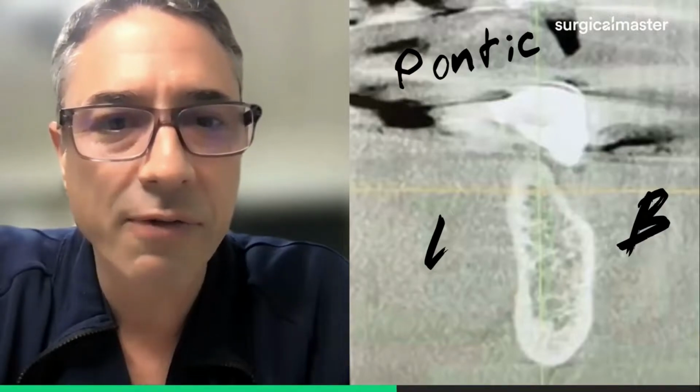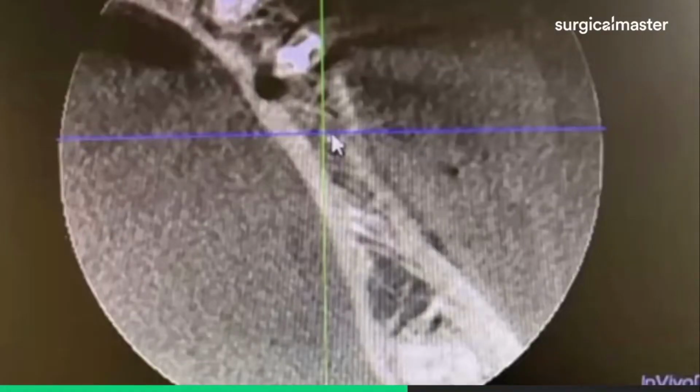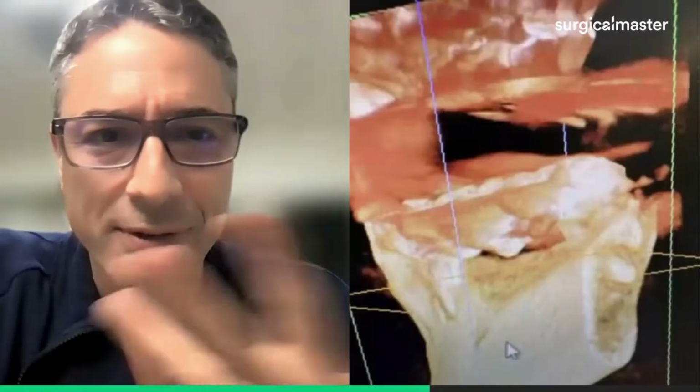I think that's very helpful. Here is the axial view of the ridge, so we can see some thinning. It's a bit thicker in certain spots. Here's a 3D rendering. I don't use 3D rendering that much. It's a cool photo, it just gives you an idea about the jaw shape.